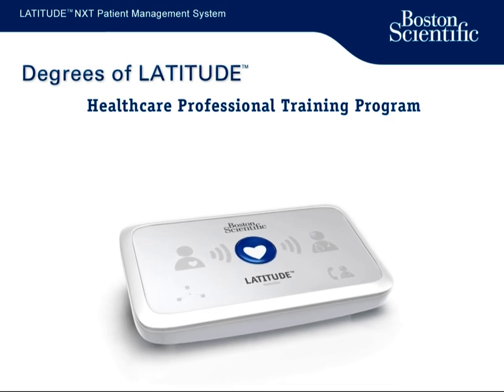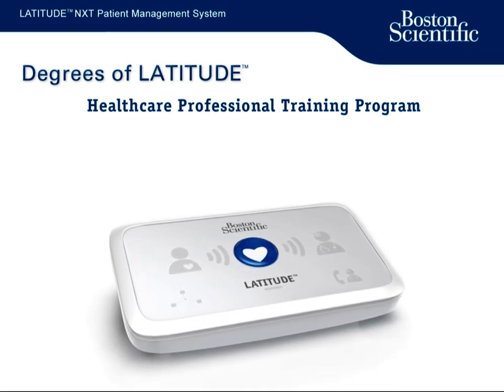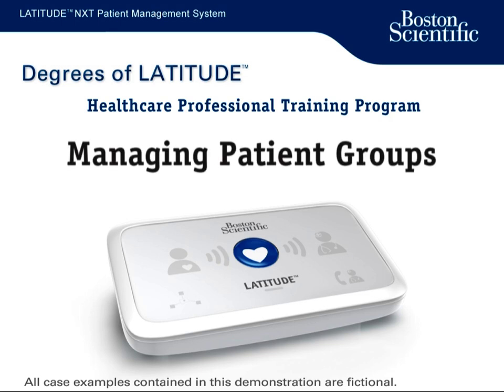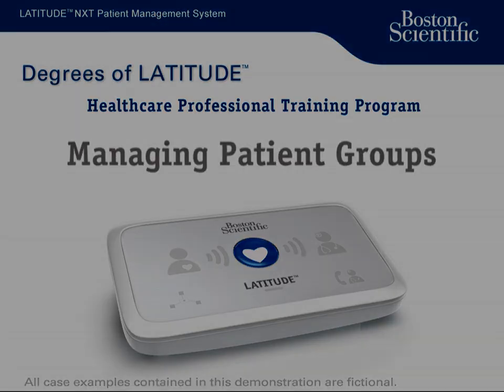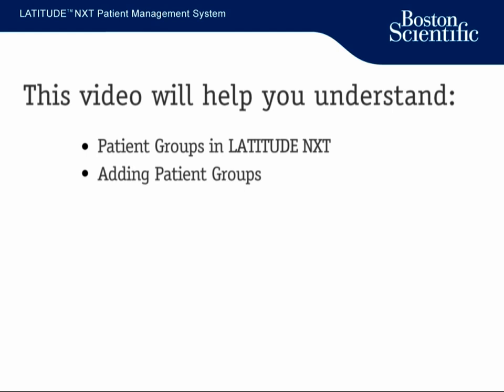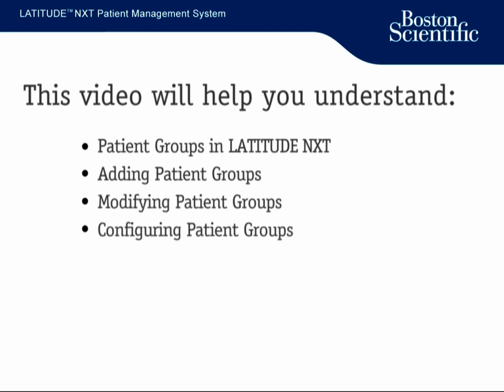The Latitude NXT website offers you flexibility and control over how you receive, review, and manage Boston Scientific device and patient data. In this training module, you will learn more about managing patient groups in Latitude NXT. After viewing this video, you will better understand patient groups in Latitude NXT, adding patient groups, modifying patient groups, configuring patient groups, deleting patient groups.